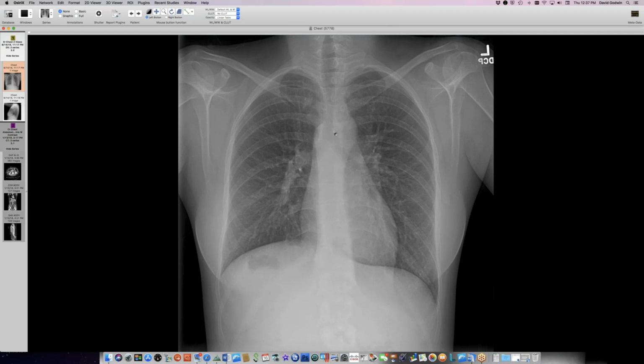I wonder whether this, when I first saw this, I thought it was something aortic, because the trachea seems to be affected, and I thought, could this be some sort of a vascular ring? But we seem to have a good descending aorta on this side, so if there were two descending aortas, that would be unusual. Even above the aortic arch, it almost looks like there's too much soft tissue that's displacing the trachea rightward. Yeah, sometimes you'll see an aberrant right subclavian do that. So yeah, I was thinking something aortic when I first saw this.